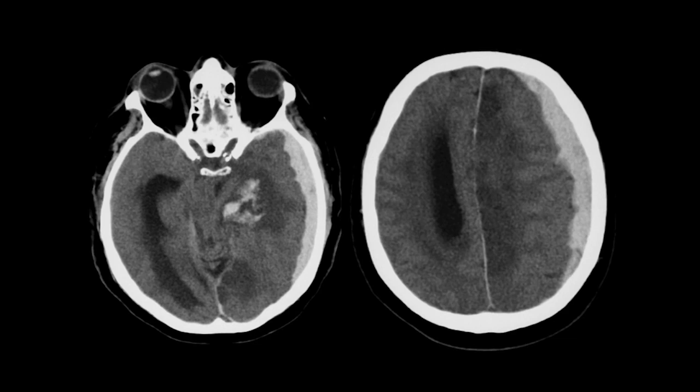So the usual suspects in terms of traumatic injury are going to therefore be skull fractures, epidural hematomas, subdural hematomas, cortical contusions, traumatic axonal injury, and then the secondary consequences of injury, including subfalcine shift, transtentorial herniation, and subsequent cerebral ischemia or infarcts related to vascular occlusions.